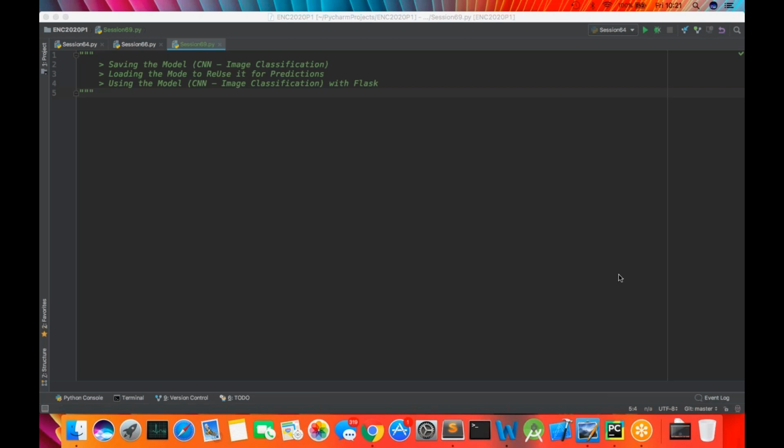I'll use the model with Flask. This is going to give you an application environment showing how you're going to write any AI app with Flask. Of course, there will not be much decoration on the UI front, but you'll get a very comprehensive idea of how you have to work on your projects as well. So let us start.